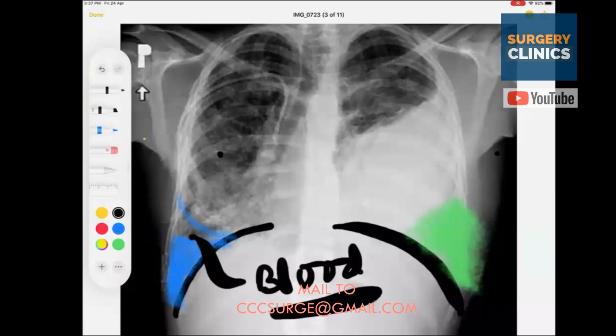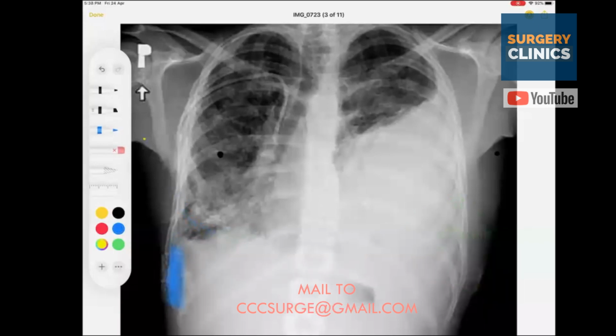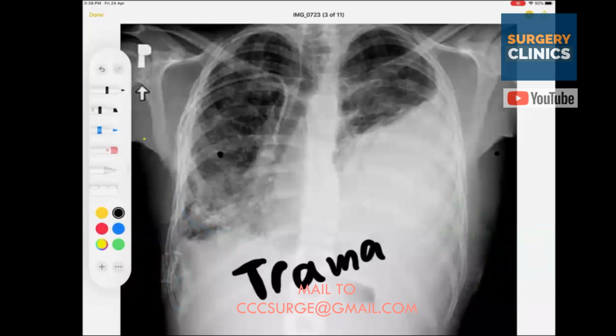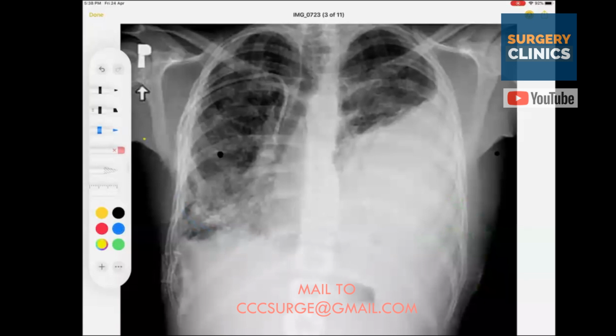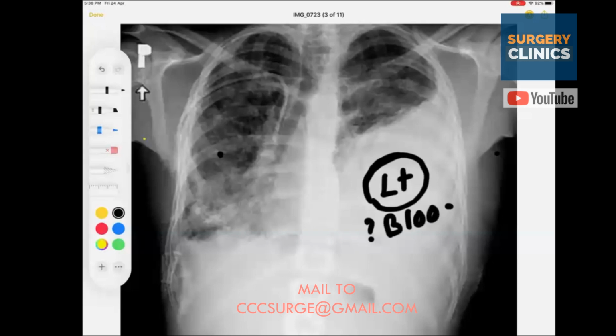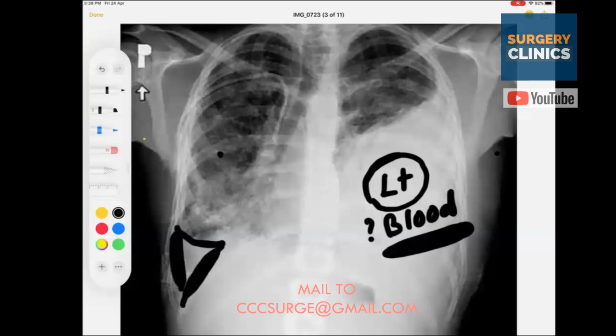Okay, so this is something that is there. So that means this patient is probably a patient with trauma, that means an accident, and after the trauma, what is very simplistic to remember and understand is that this chap has had a left-sided pleural collection, maybe blood. In an accident, you expect blood to come out. And on the right side, yes, there is, so probably blood. But what is more dangerous for this patient is that the left-sided problem is compressing upon the mediastinum.